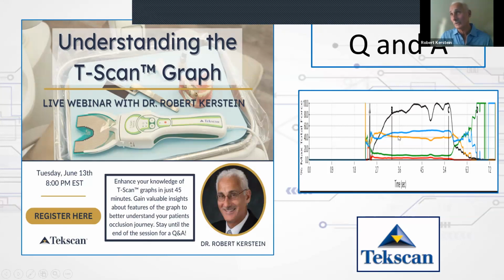I hope you now can look at this and understand some of the key features. For example, there's excursive friction. There's the patient struggling to close. There's the inability to hold their bite together. They lose force, they squeeze, they lose force, they squeeze. And then, of course, the excursive friction, but they also have posterior teeth involved. Their anterior guidance finally works. That's reading the graph without playing the movie. That's what I hope many of you are able to do after this seminar.